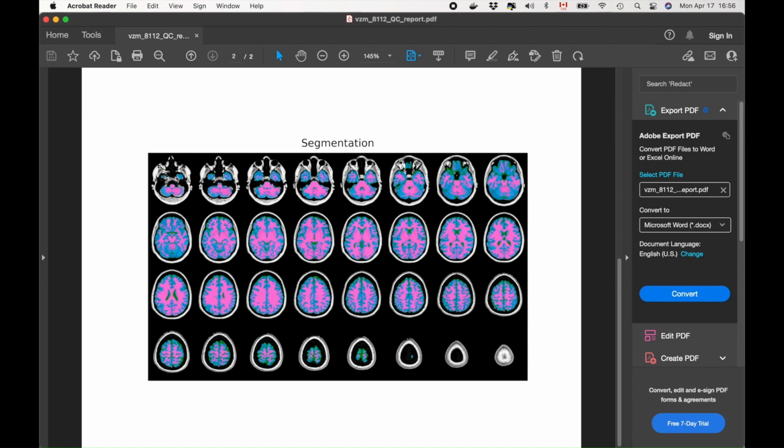Note that the main factor that affects the results of these processing steps is the quality of the images. In other words, you cannot get reliable texture maps if there are artifacts due to movement or any other problems during the acquisition, such as low contrast or strong image interpolation. Therefore, we strongly recommend the use of the HARNESS protocol.